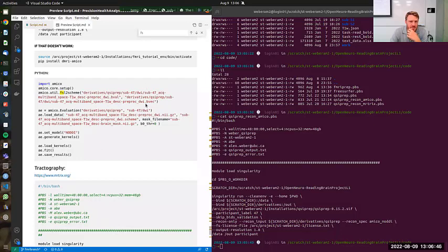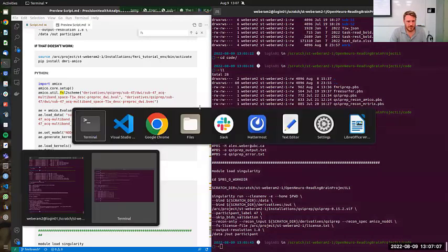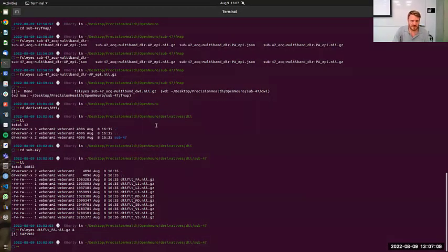So essentially you just give it a bval, bvec. It creates a scheme, which I think just combines them. And then you just tell it what preprocessed data to gather and the brain mask, and then it will run everything. So I did run that on my home computer for illustrative purposes.